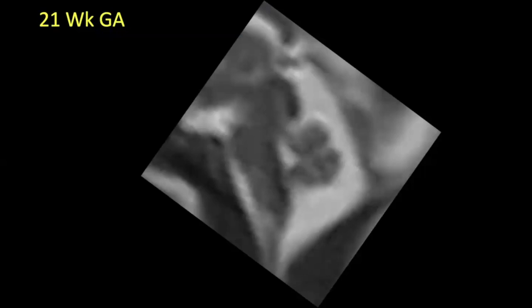And on 1.5 Tesla MRI, by 22 weeks, you should really see all 7 vermian lobules. The first 3, 1, 2, and 3, are part of the anterior vermis here. There's the primary fissure. And now 4 is what people call the DFT because it's comprised of the declive, folium, and tuber. We can't really separate those out usually on fetal imaging. If you do, it's later in gestation. And then lobules 5, 6, and 7, 7 being the nodulus.